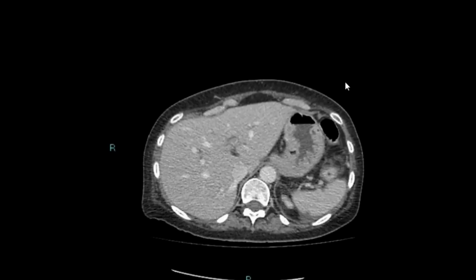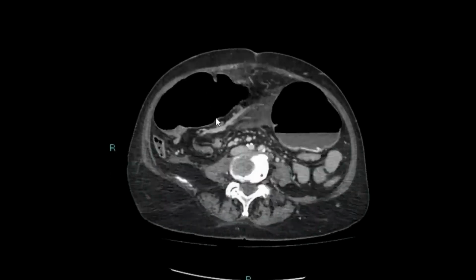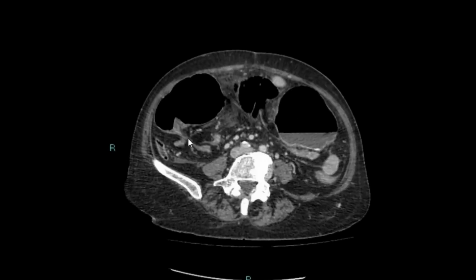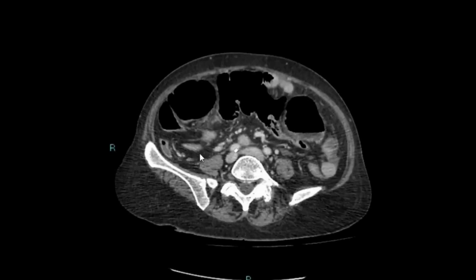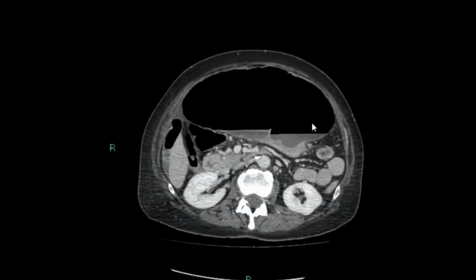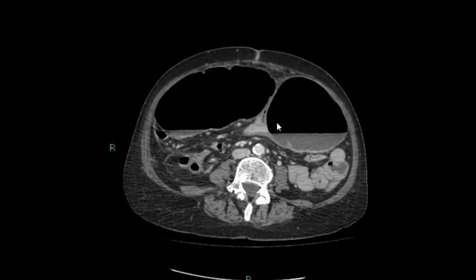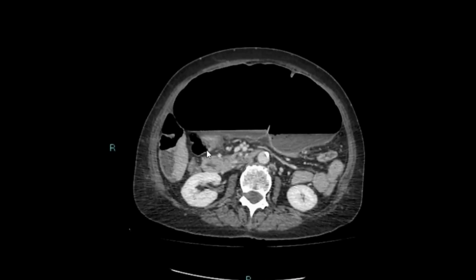We'll go to our CT, and again we can see this very dilated cecum, and we can follow it along here. Now we see here it's dilated and it's tapering down, and here is a transition point, an abrupt transition point where now the bowel is collapsed. Okay, and then we'll follow to the other side, and we can see here, again, very dilated, and now tapering down very rapidly. Here it is. Again, abrupt caliber transition point here, and we can see it coming over here.